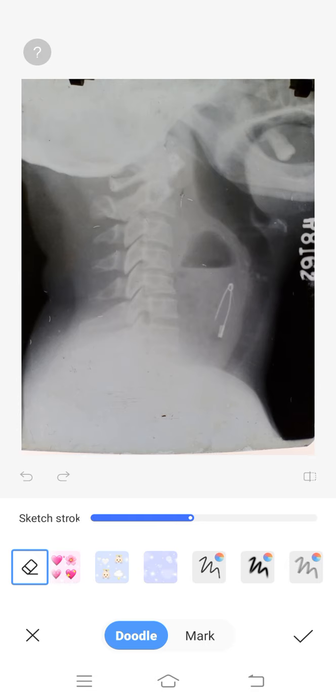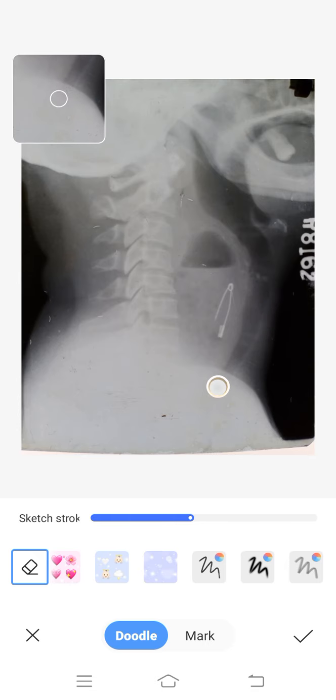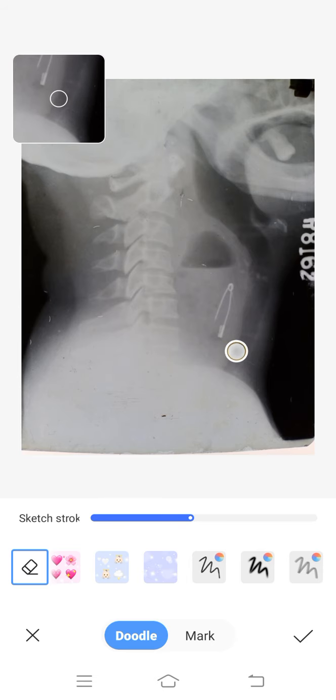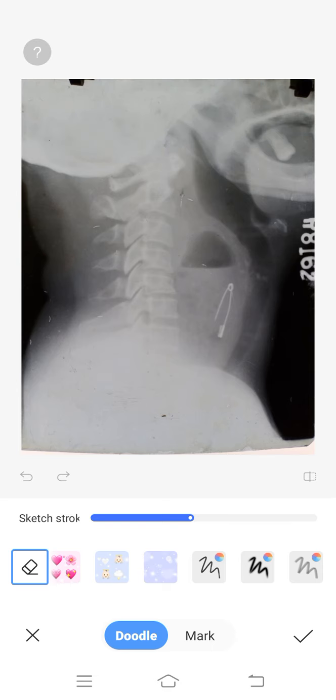As you go down, notice that the airway is narrowing. This black shadow, the radiolucent airway, is getting narrowed. That is because the area between the cervical vertebra and the posterior part of the trachea, the prevertebral soft tissue area, is grossly widened. We call it widened when, comparing it with the body of the cervical vertebra, the prevertebral soft tissue shadow exceeds half or 2/3 of the width of the body of the cervical vertebra.